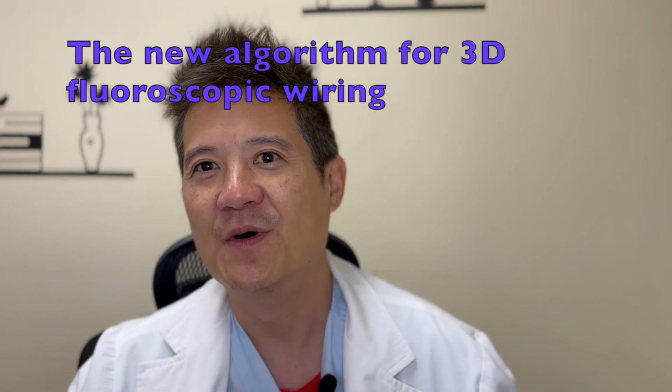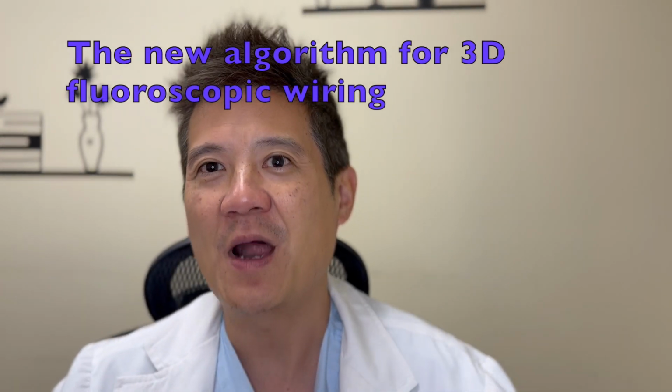And I've tried a couple of videos. You might have watched those videos where I was trying to explain. It's a process of me trying to work out how to solve this problem. And now I think I've come to somewhere that's a little bit better. So I'm doing another video on the new algorithm for 3D fluoroscopic wiring.